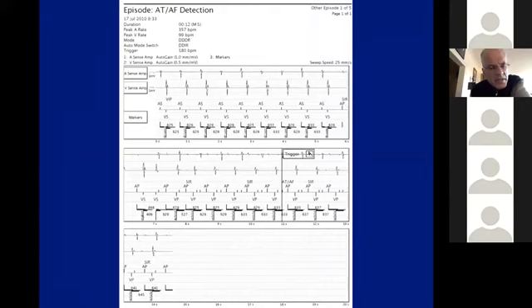This is sort of interesting. So it starts as a sinus, then again, sinus sensor indicated rate. And then you have this interesting combination of markers. So you have V-pace, but in between them, there are three markers. There is one A-sense, another A-sense, and then A-pace. Why are there three markers? What is the device thinking? What is it seeing?